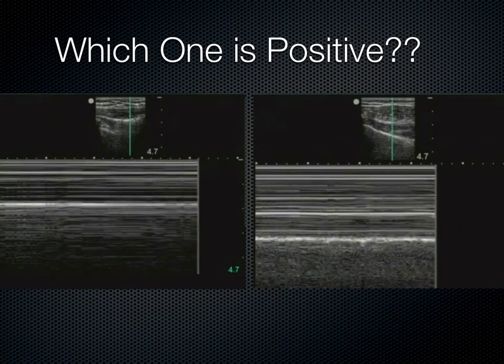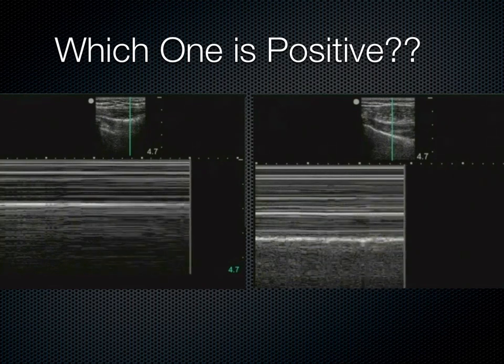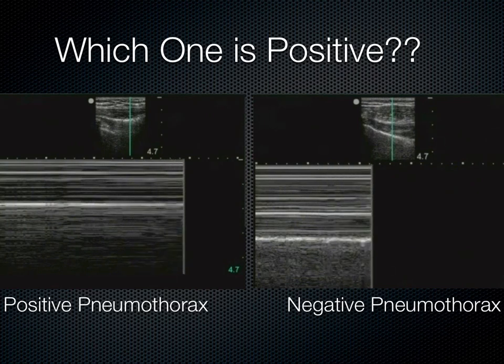And again, last examples, which one is positive? Right, so the negative pneumothorax again, Sky-Ocean Beach.